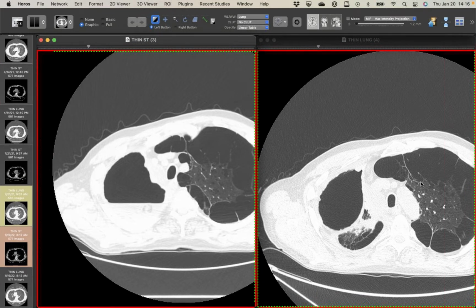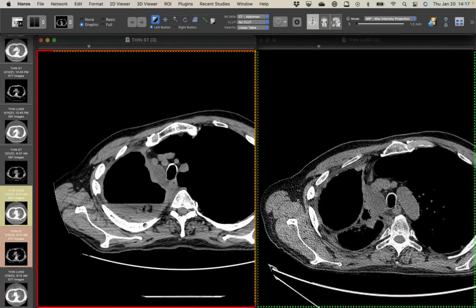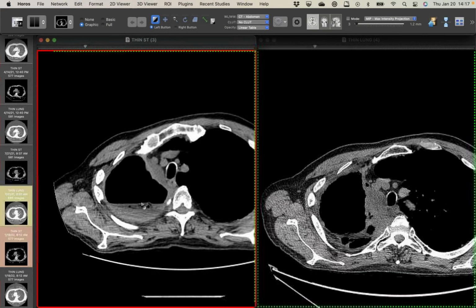It is fascinating, and it's purely a conjecture of what's going on. But the fact it's been doing this for over a year, we're pretty confident. I mean, if this were tumor at this point, it should have declared itself, getting more and more nodular. And the fact the cavity wasn't part of the cancer, and the cavity predated the cancer, I think makes us all confident that this is just chronic ischemic injury and necrosis. And I'll be interested to see what happens with it over time. But I do think this is a pretty good example of just sloughed lung hanging out in there, and hopefully it'll just resorb. Okay, well, those are my bizarre cases of the week.